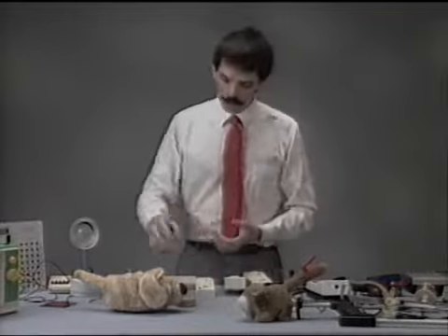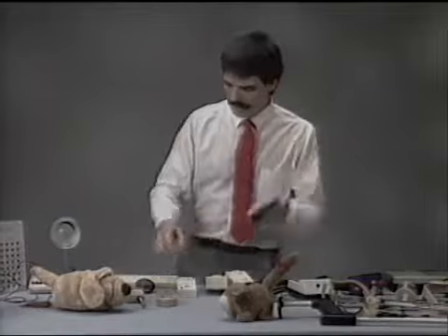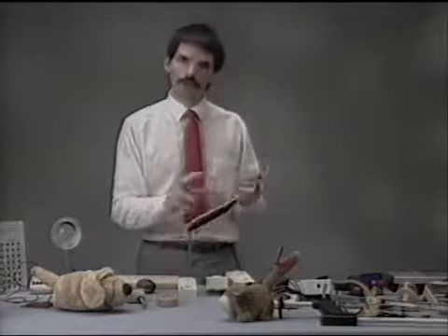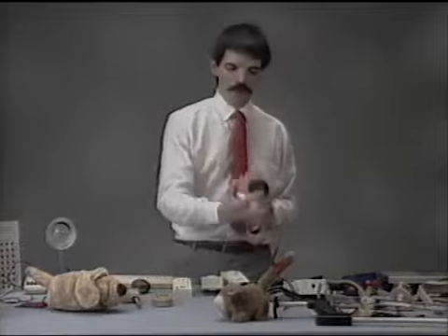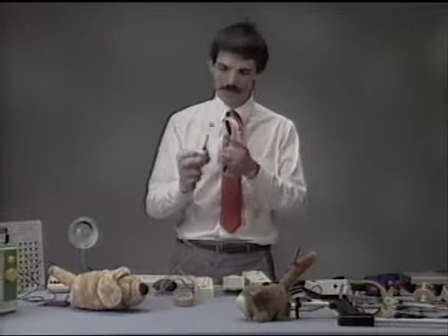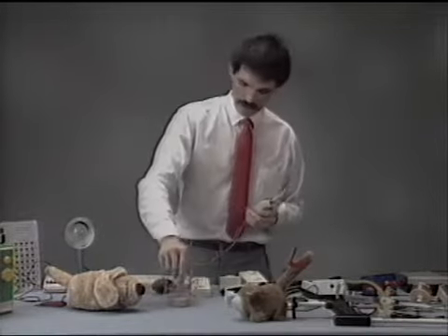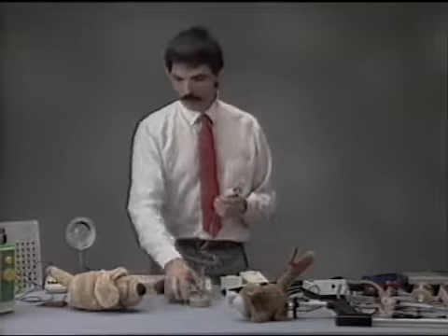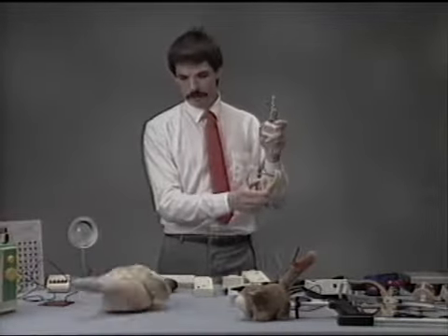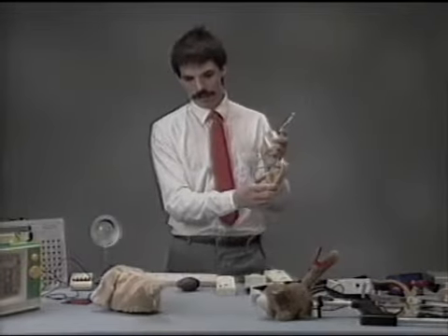There's other types of toys. This one, obviously, there's a connection between the toy and the switch. Here's a toy, and I'm going to activate it with a different type of switch. All the switches have different names. This one's called a plate switch. Somebody has a great time thinking these names up. This is called a wobble switch because it wobbles back and forth. And by plugging it into this remote control for this toy here, and this is another toy from just a regular toy store, I can turn the switch and off the toy goes.